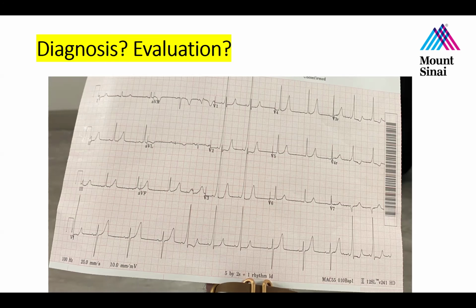No worries. Okay, so it looks like we do have a sinus rhythm. I see P waves before every QRS, about 3 beats into the tracing. The QRS complex looks different for a few beats, in the middle and at the end. And it looks like those beats are pre-excited. So I would say we have intermittent pre-excitation. That's exactly right.